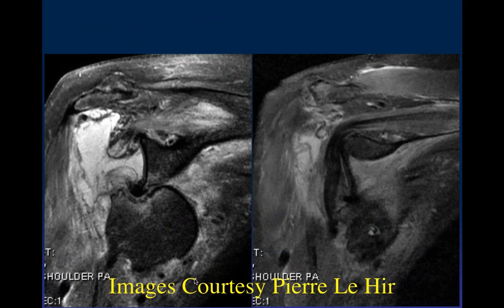Okay. So I think, let's see, Jonah, is this normal or abnormal? Probably normal variant here, I think. Yikes. So, yeah, we've got a nasty inferior dislocation, Hill-Sachs type deformity. So this kind of shows the mechanism here.